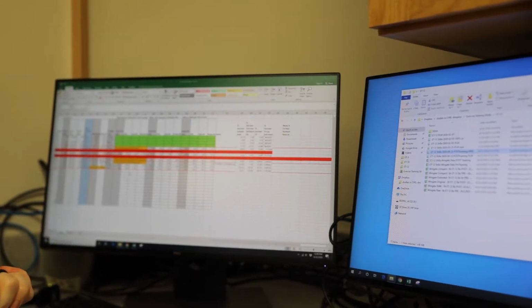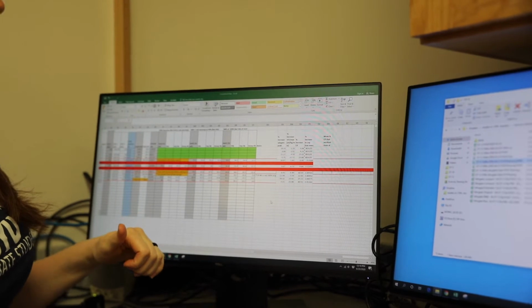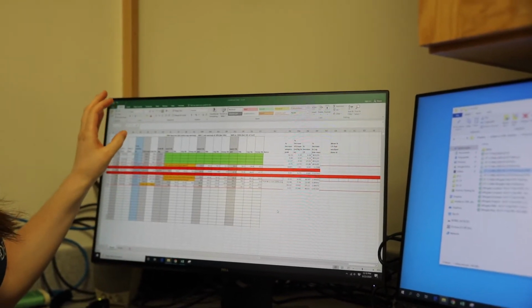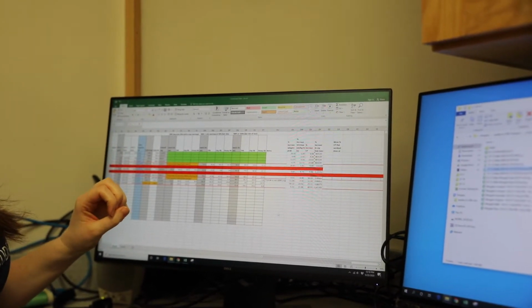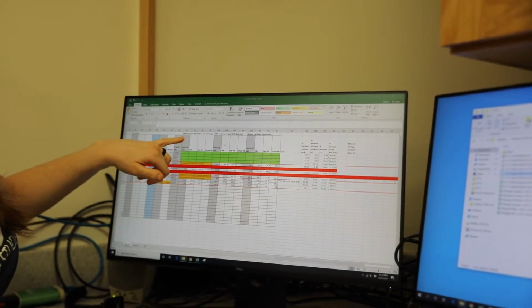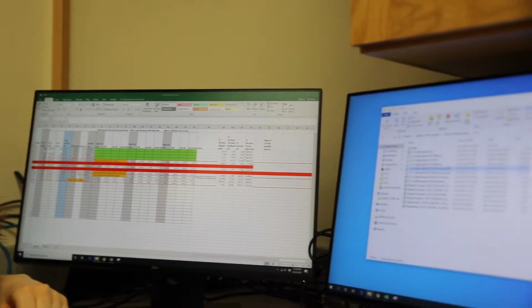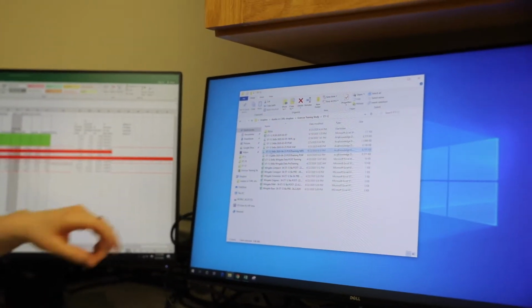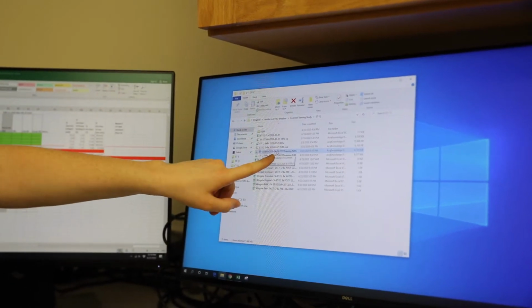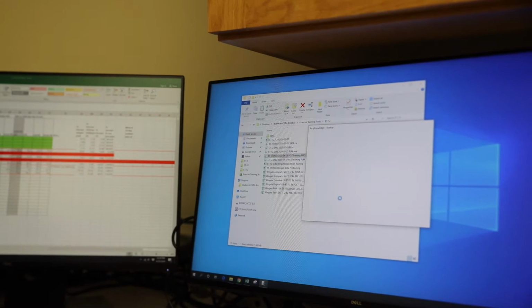To analyze NIRS data, we first need to pull up the Excel sheet that we'll be putting the data into. So I've pulled up the Excel sheet for one of our current studies, and we've got it marked, the 3 points in the NIRS that we want to collect data from. The second thing you need to pull up is the NIRS file, and it should be labeled within a subjects folder. So we're going to double click on that.